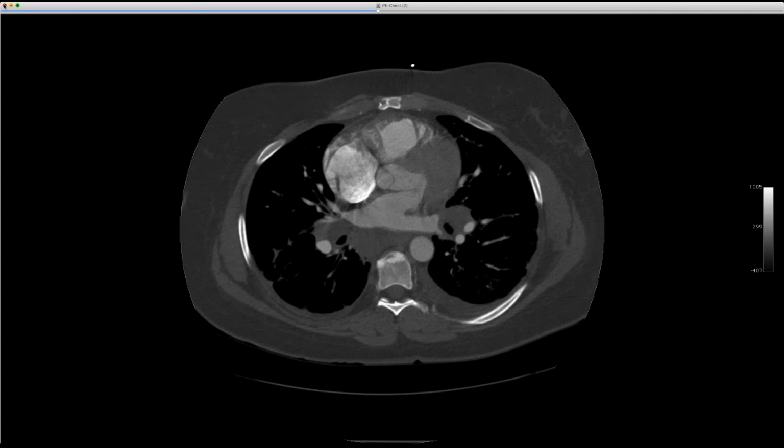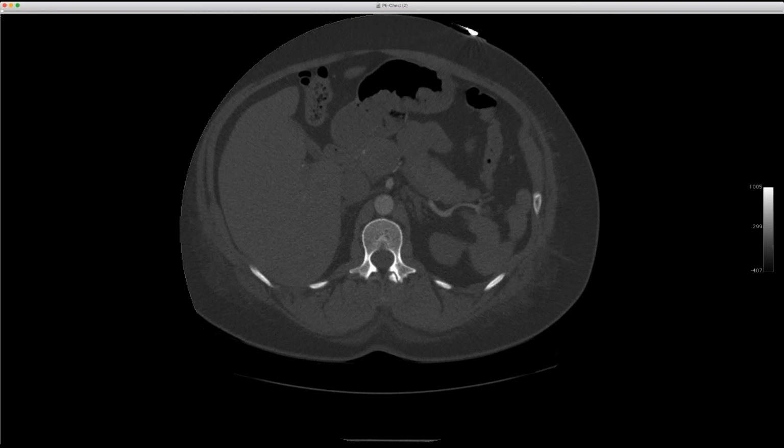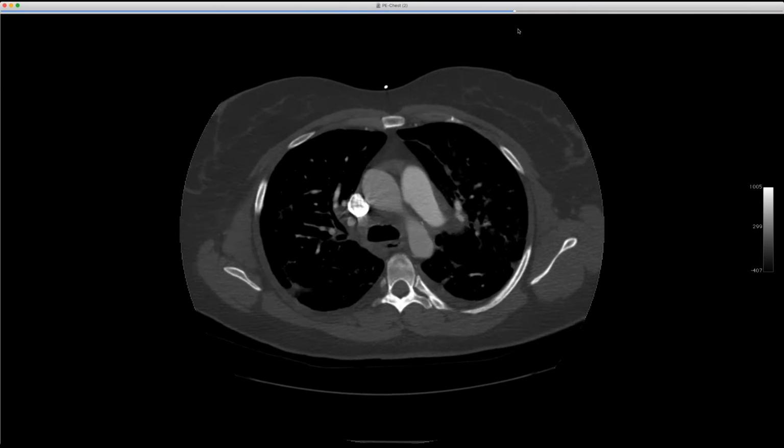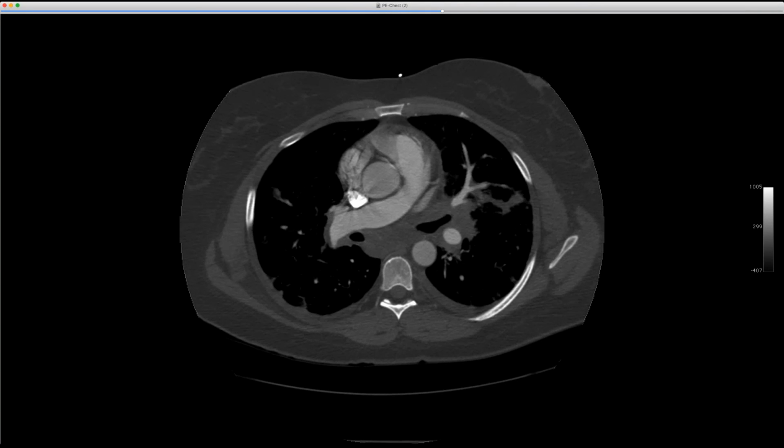All right. And also, this case is like the one that I think is sarcoid from here. But the lymphadenopathy is amorphous. Normally, sarcoid lymphadenopathy is very well defined, has clean borders against mediastinal fat, but your case and my case both have this just amorphous lymphadenopathy. So what I suspect is mediastinal fibrosis from sarcoid, and where it differs from mediastinal fibrosis from histo, where you get a big, solid, ugly, calcified mass. Got it. Jeff, be sure to post this case because I want to show the people here. Yeah, I will fix my networking issues.